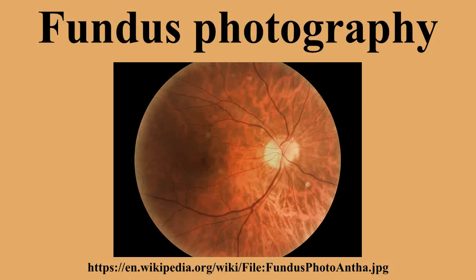1. Computer-aided animation and analysis of time-series retinal images have been suggested to observe retinal conditions. Matched flicker is a technology that automatically aligns and registers two images of the same retina taken at different points in time, thus generating a superimposed view which identifies any changes present between the two images. Matched flicker assists to improve both the speed and accuracy of image diagnostic evaluations, resulting in more effective workflow, more precise diagnosis and simplicity of recording.